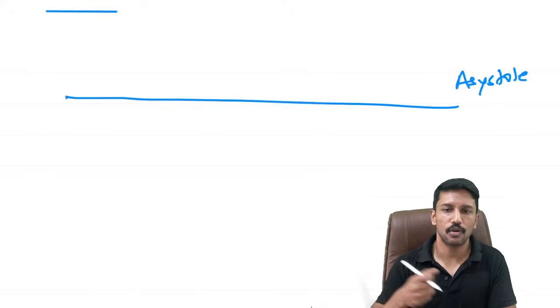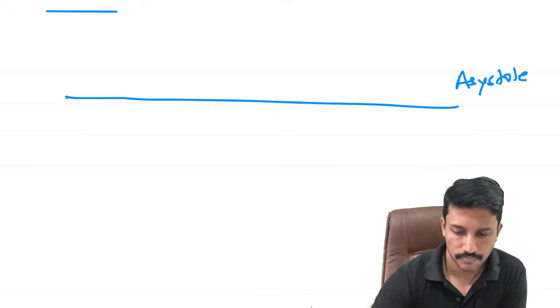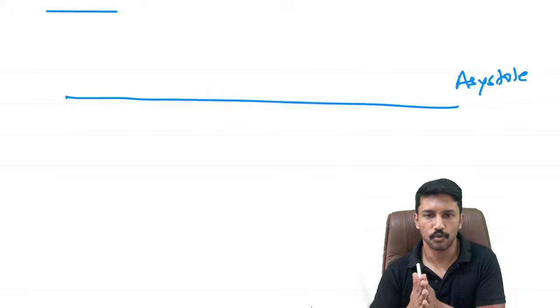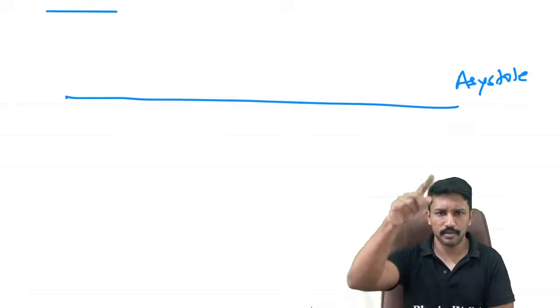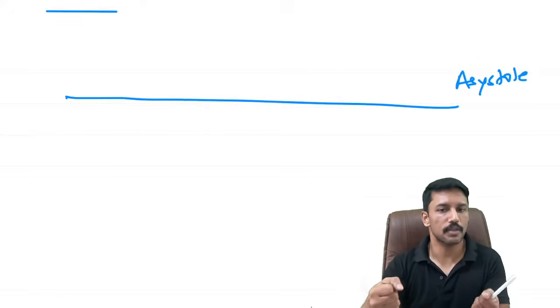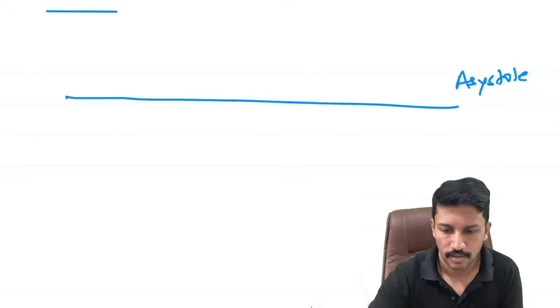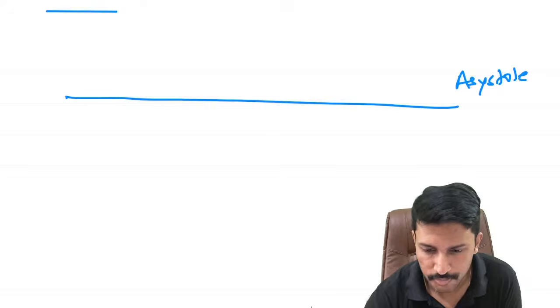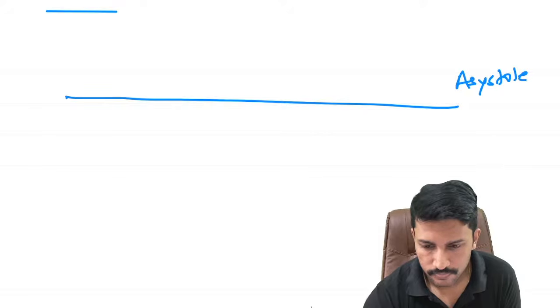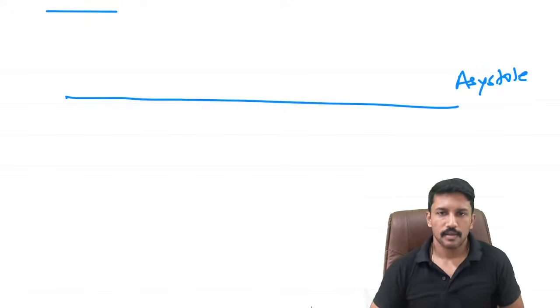Should I shock this patient or not? If you are the treating doctor, will you shock this patient or not? Would you give shock or no? If in front of me there was some ECG activity happening, then it became a flat line, should I now give shock or not? We'll come back to arrhythmia later, but this is a very important point for us to understand. How many of you would like to give shock to this patient? Yes or no?